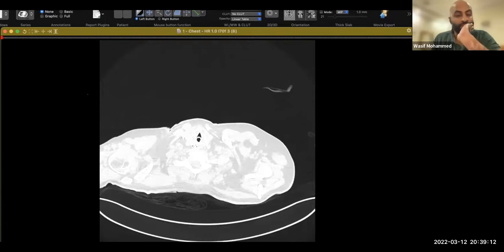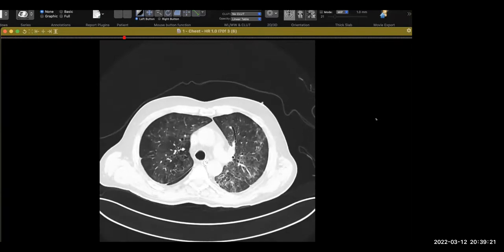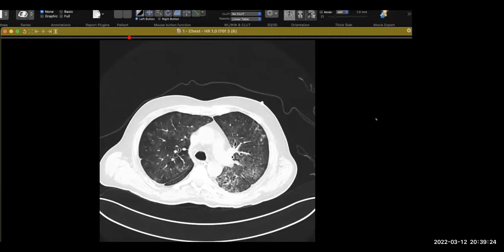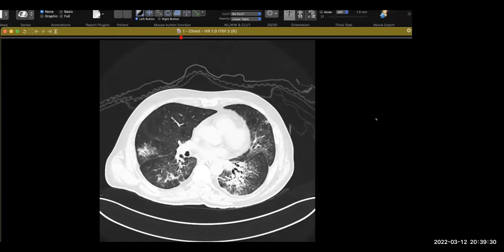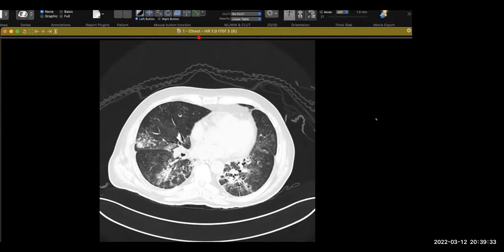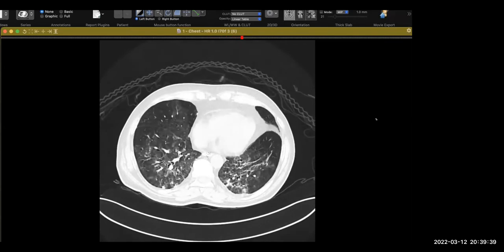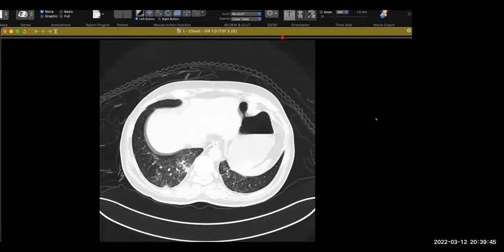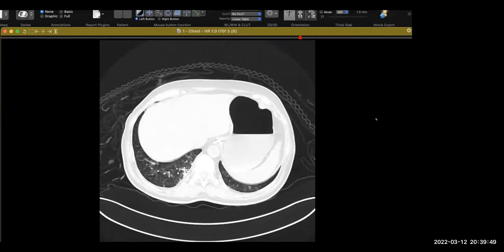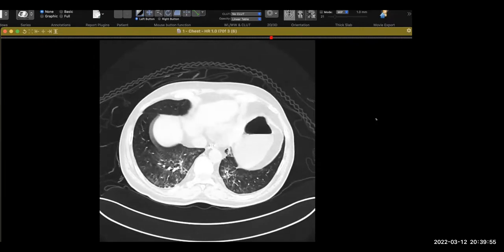Can you go through these CT images? Sure. So I am going through the CT images of the patient who has presented with respiratory distress and fever, and I can see opacification and some ground glassing noted along the perihilar as well as the peribronchovascular regions, and a bit along the peripheral distribution as well. I can also see some fibrotic changes.